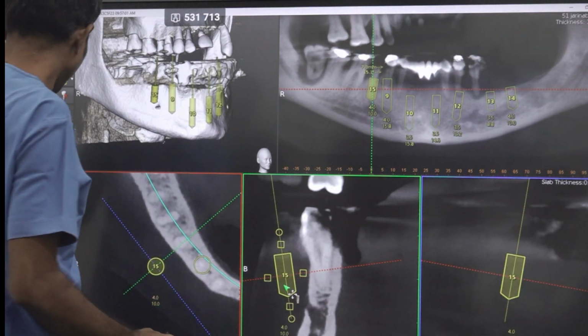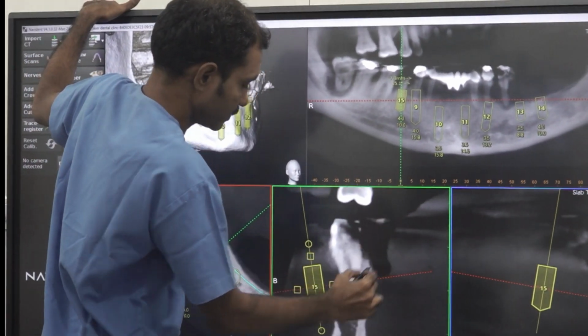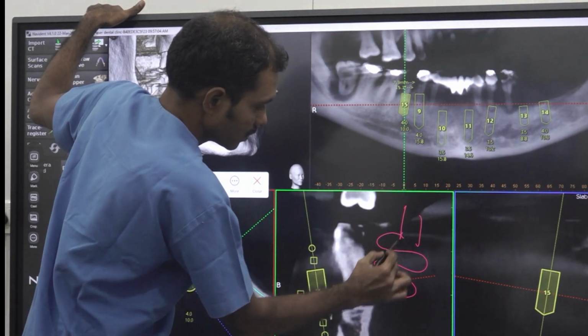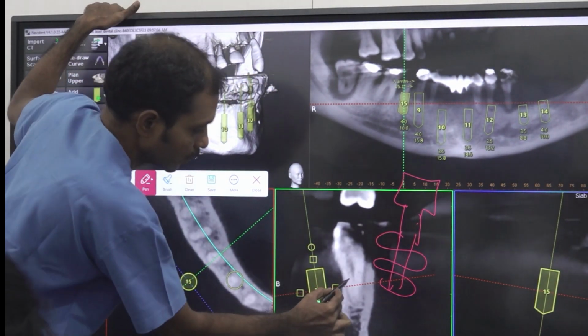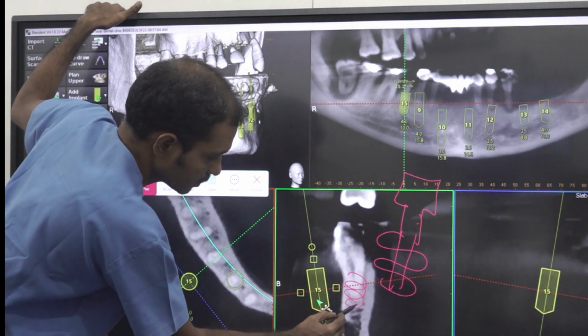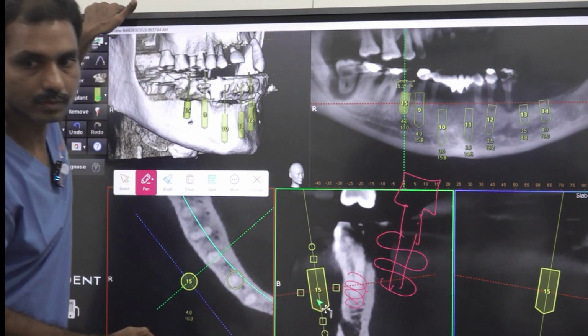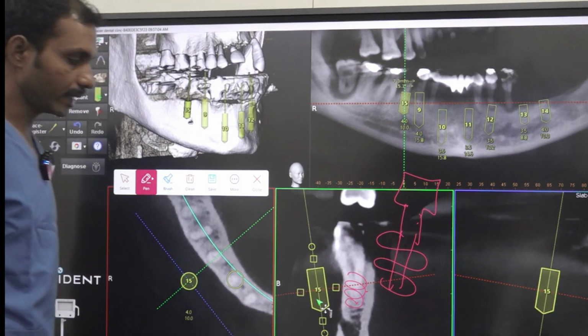There is one design in basal called the 5.5 design. These threads will be 5.5 wide implanted. So if you place a 5.5, it won't get support from this bone, but it will get support from this bone. This buccal and lingual engagement.